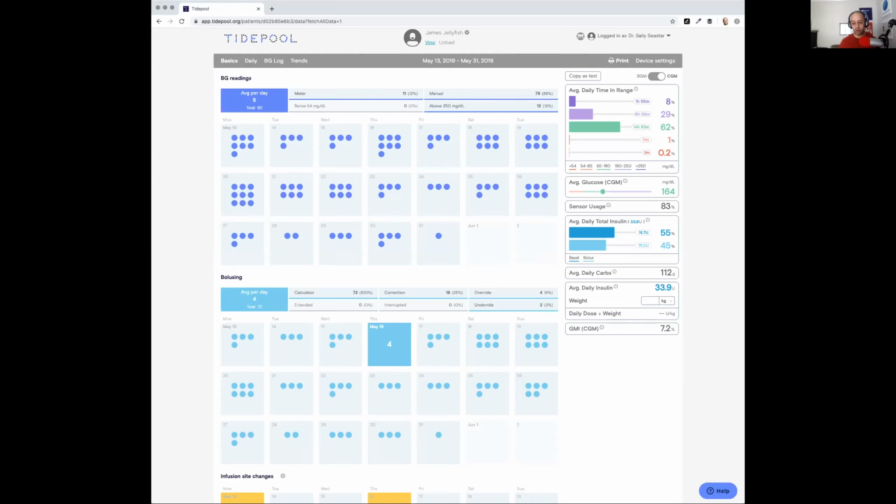Another follow-up question from Lisa. Thank you, Lisa, for these questions. What is the value of the insulin to body weight ratio? Honestly, I don't know. My doctor likes to use this one. I don't actually look at this because I don't want to put in my weight, because I'm a little self-conscious about that. There's shelter at home stuff, so I'm not really worried about that. But in terms of the actual medical value of that, I don't know. I'm not a doctor. My doctor utilizes it and he seems to think that my values are okay. I'm not the right person to be informed on that. So I'm going to look into that and we'll get back to you tomorrow on what the actual value of that is. How about that?